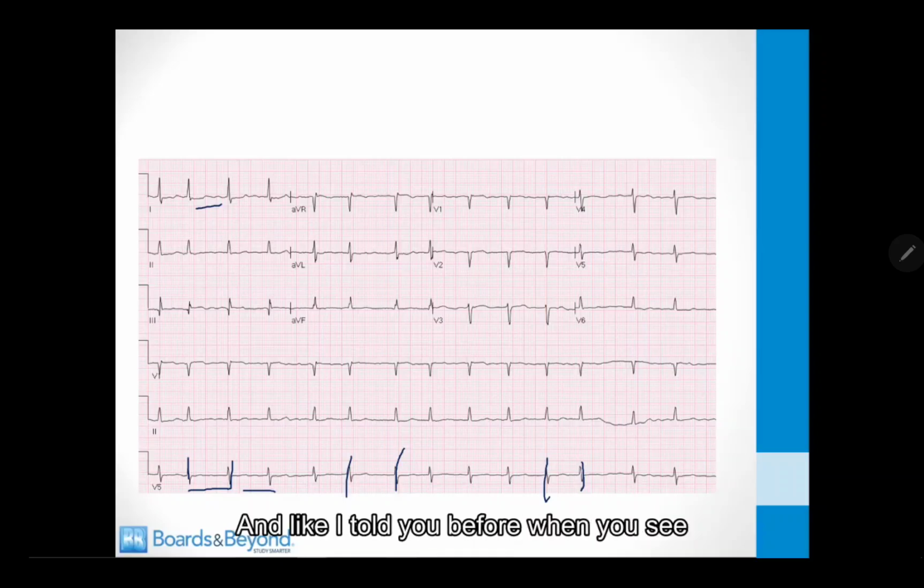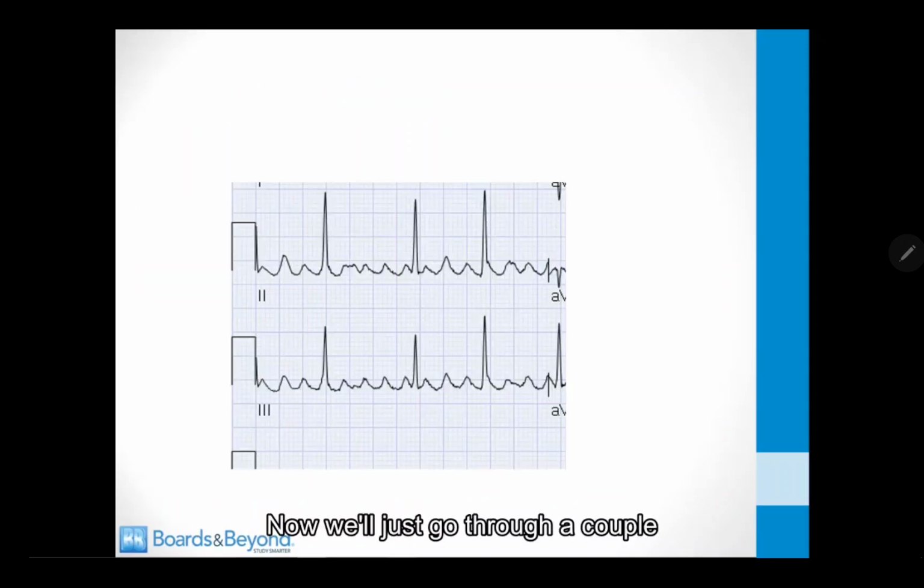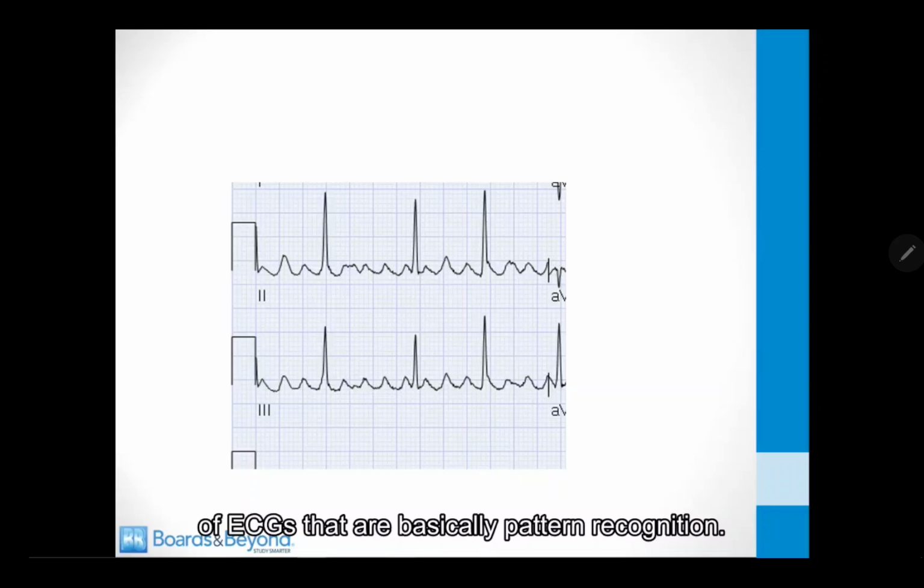And like I told you before, when you see that, most likely you're looking at atrial fibrillation, and that's what this ECG shows, atrial fibrillation. Now I'll just go through a couple of ECGs that are basically pattern recognition.